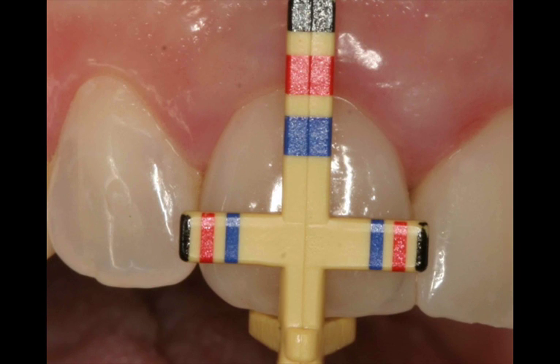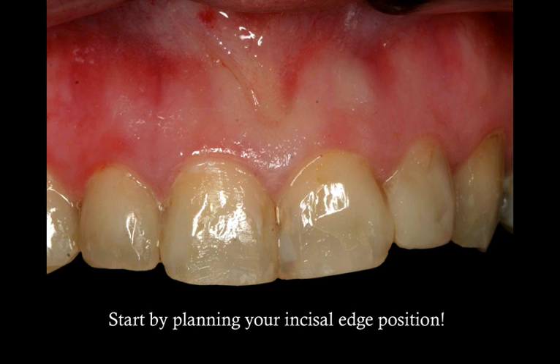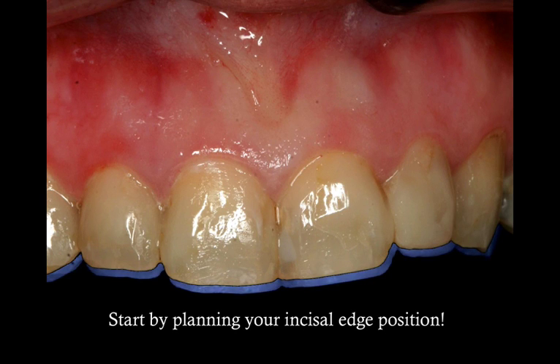The other thing you need to keep in mind is that you're placing it on the incisal edge position. So you need to make sure that when you make these decisions on the gingival margin, the incisal edge is where you want it to be, because this is your reference point. Sometimes we're planning to increase the incisal edge position, so you need to make a really good plan for what to do first.